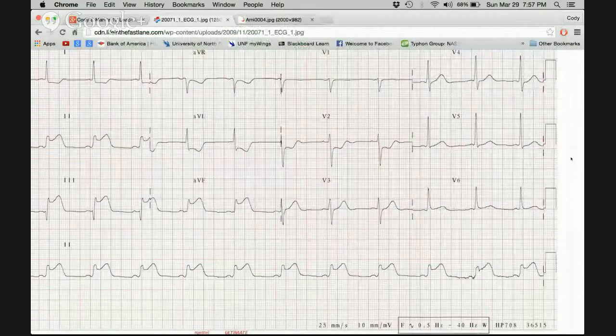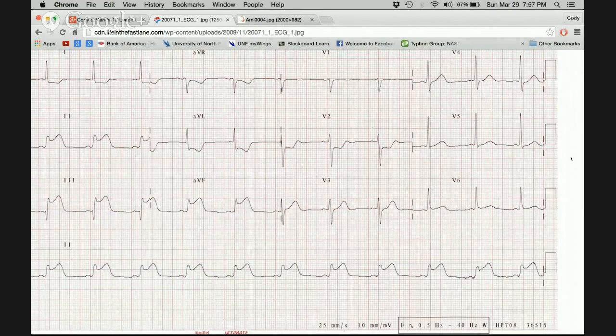We're going to be doing 12-lead EKG interpretation using Dubin's 5-step method. First we're going to begin with rate. We're going to be counting down the large boxes from 300, 150, 100, 75, 60, and 50, which this rate is about between 60 and 75.